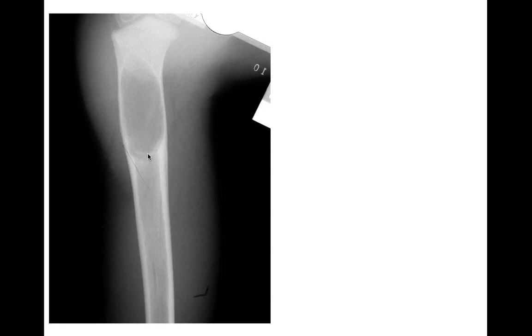In this case, that would make it another unicameral bone cyst. I don't actually see a pathological fracture here, but if this is a fallen fragment sign, there must be one somewhere. Centered here in this case in the metadiaphysis of the proximal femur. So another 1B lesion, narrow zone of transition, non-sclerotic border, unicameral bone cyst. Really not much else to consider here. Again, a benign lesion, no advanced imaging necessary. That's it.